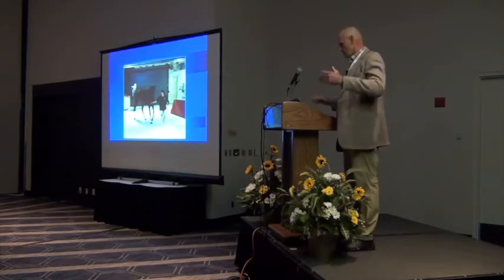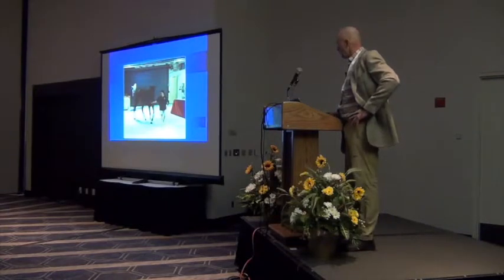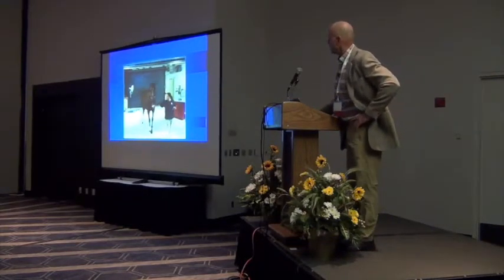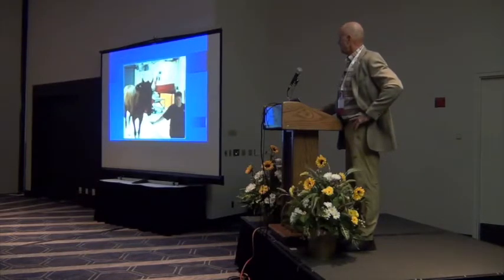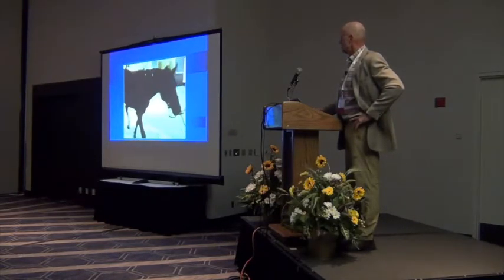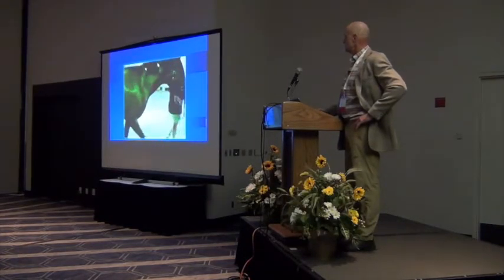Now, I only put this in here, and I don't think that it's going to portray very well. It's a little dark, but hopefully this is kind of a common presentation of a horse coming out of the field. Can you see the lateral luxation of the shoulder joint?